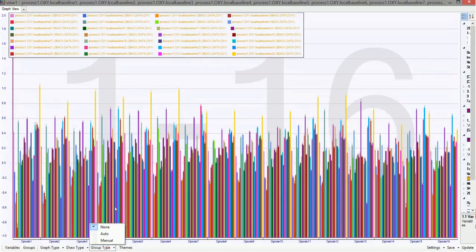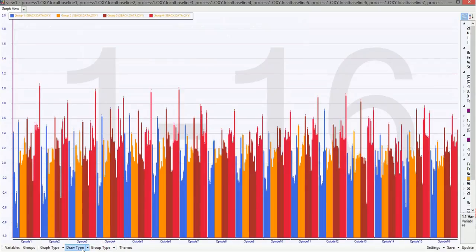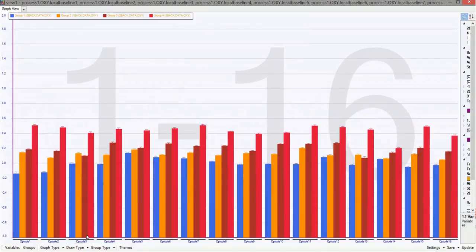Now we will look at this instead, and we will use auto, and I can also aggregate them. And now you see that the result is what we expect. So this also shows how important it is to pay attention to the baseline, because in the previous test, when we used the global baseline, because this is a 40-minute file, at the end of the test we were still referring to the baseline, which was like 30-40 minutes ago, and this really doesn't make much sense.